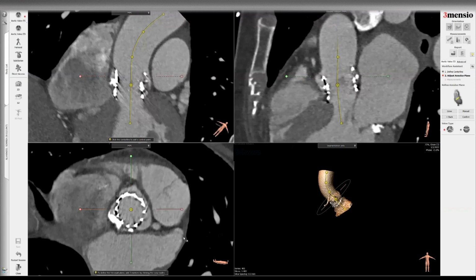In addition to the CT, I would also suggest you get a cardiac cath and go to the LAO cranial view, take the parallax off the transcatheter valve and do an aortogram to see the relationship between the transcatheter valve frame and the left main, to determine coronary obstruction risk and risk of sinus sequestration. Because there might be motion artifacts or quality degradation, or blooming artifacts, with the transcatheter valve in place on CT, the fluoro and aortogram is actually more helpful in defining the true risk of coronary obstruction and sinus sequestration than CT alone.